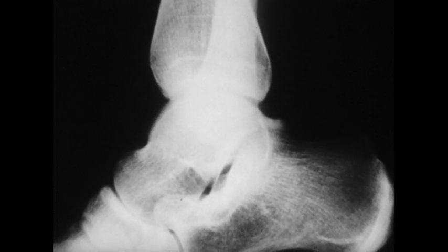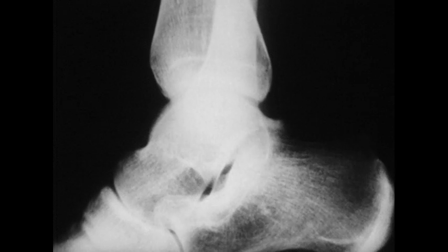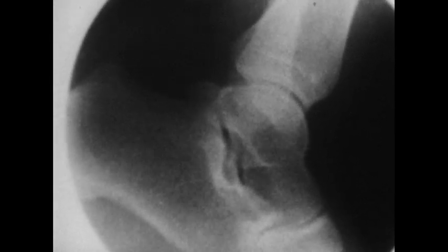The ankle is a hinge joint formed by the distal end of the tibia, the malleoli of the tibia and fibula, and the medial and lateral facets of the talus, along with its upper convex surface. The ankle has an articular capsule and synovial membrane. The support of the ankle is from the deltoid, anterior talofibular, posterior talofibular, and calcaneofibular ligaments. Motion is almost entirely confined to flexion and extension by the closely fitting bony structures and the very strong ligaments.